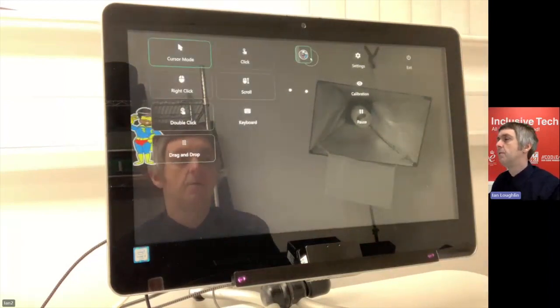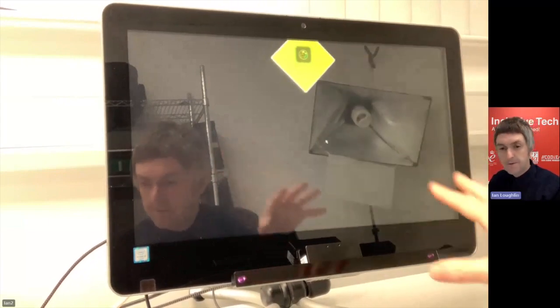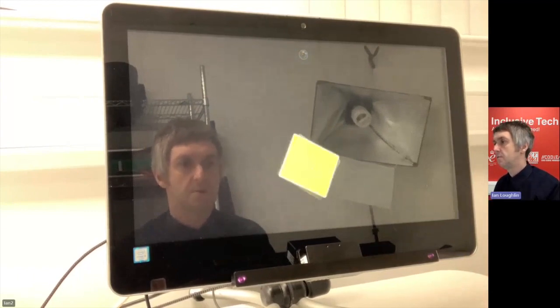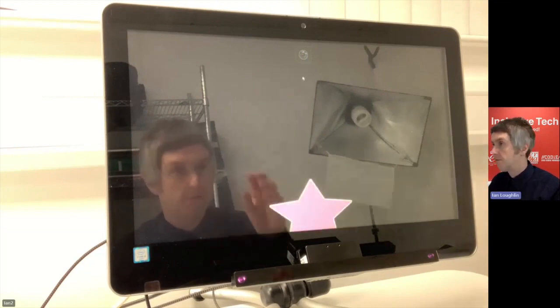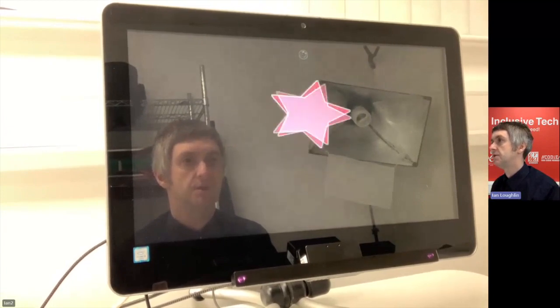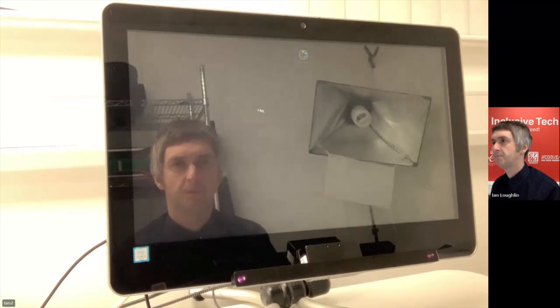That's intentional. If I then look at the shape, it will begin to move and animate. If the user produces any sound, there will be sound effects also, but these shapes don't have anything like that. Let's wait for one of the characters to appear.